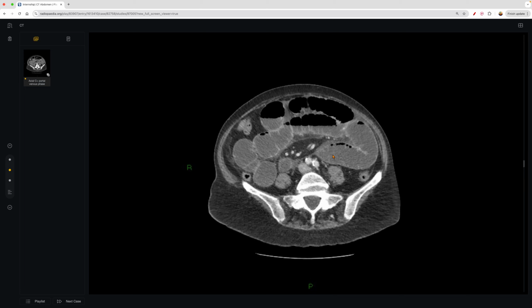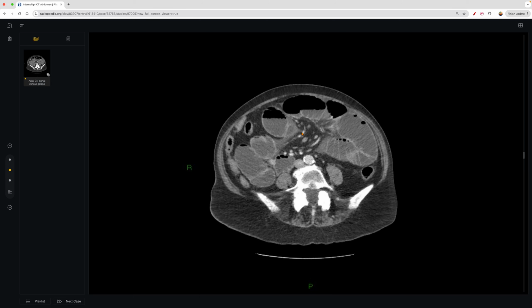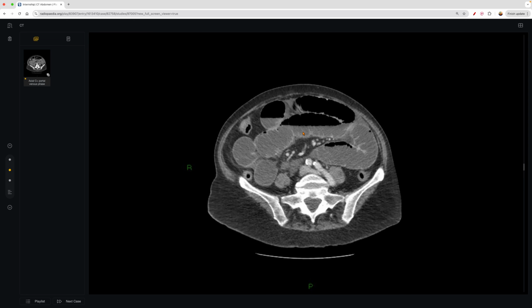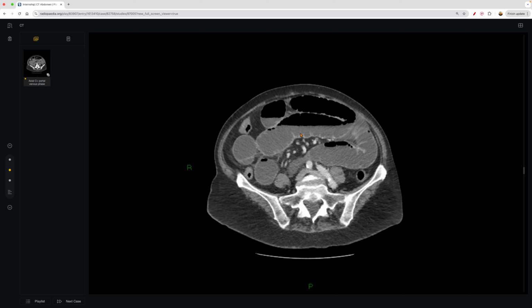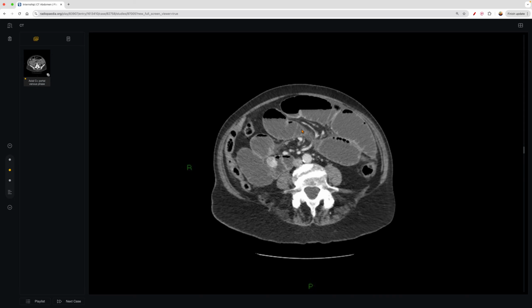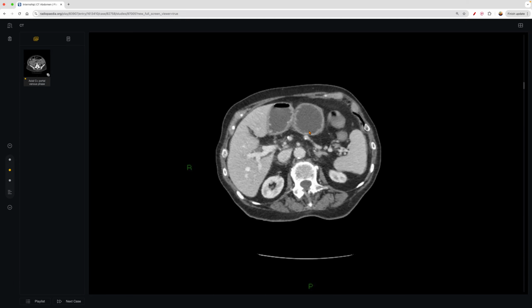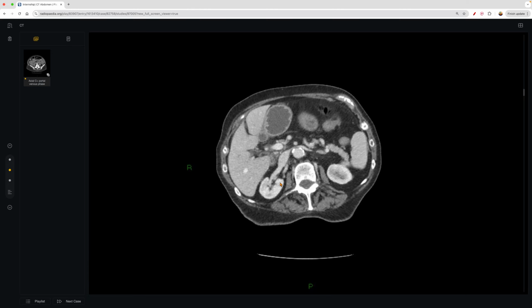So for a small bowel obstruction, you can see these air fluid levels, right? In this case, yes, they're pathologic, but sometimes you can see them in normal healthy patients, just due to gravity, if you have air going up and the fluid resting down as the patient lies supine, or flat on their back. It is expected. However, what separates a small bowel obstruction from any other normal or pathologic state is the fact that it's fairly diffuse, right? If you keep scrolling, there's just a lot of air fluid levels. It's pretty diffuse, and then we go back more inferiorly.